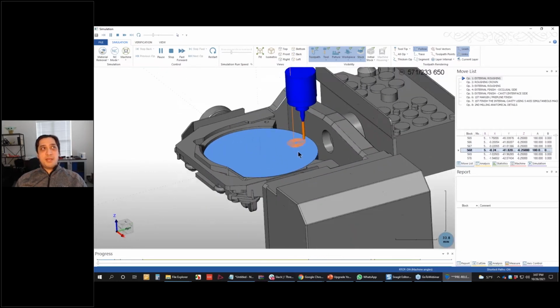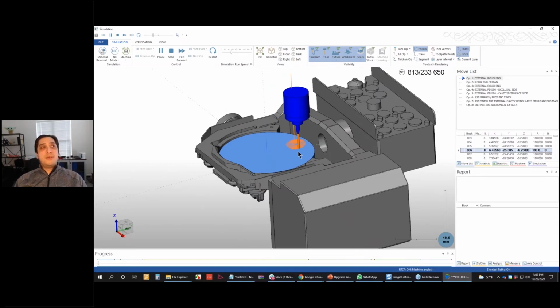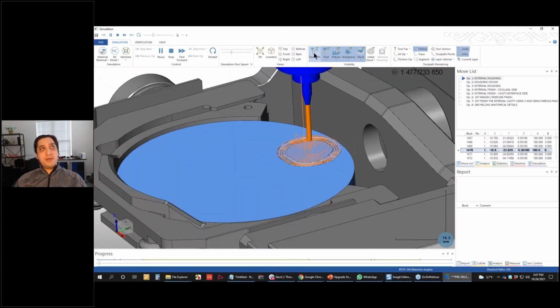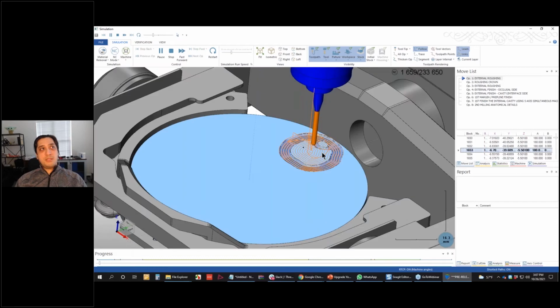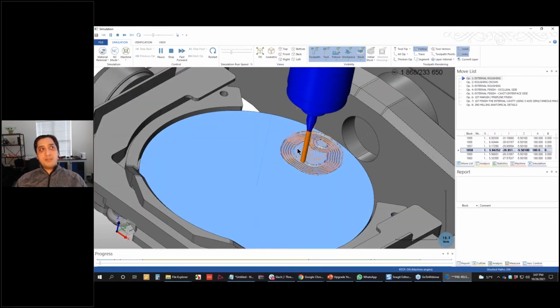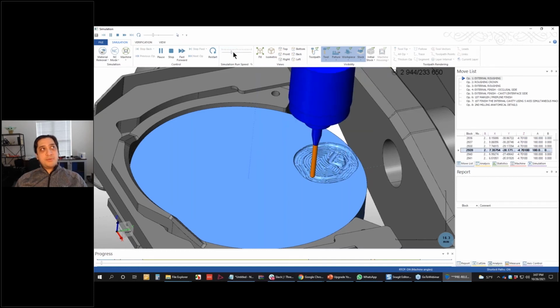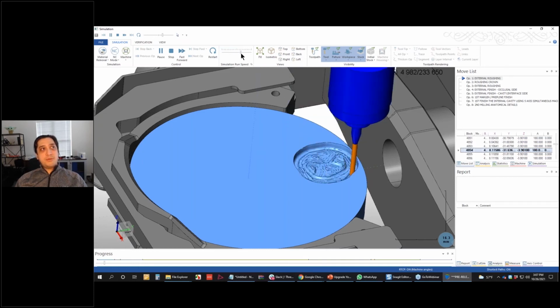Well, what does that mean? That means if the machine's actually going to tilt the disc back, we're going to see the entire disc itself tilt back. And so you can see here why the tool path is generally something you're going to want turned off, just because it leaves the tool path everywhere that it traverses along that predetermined route. Turning that off gives me an unoccluded view of my restoration that's going to be roughed out here. Now, as we mentioned, I can increase or decrease the simulation speed to get an idea of what's going to go on.